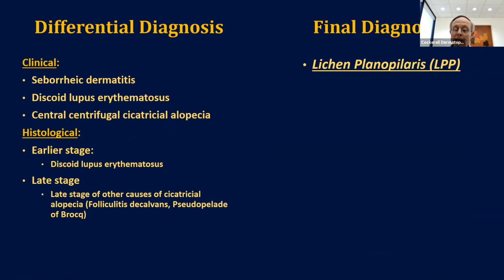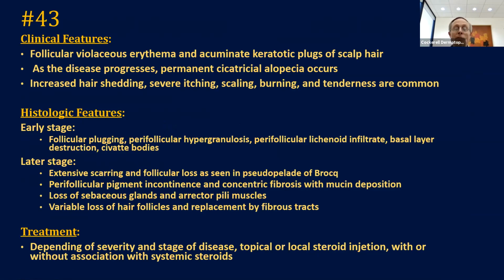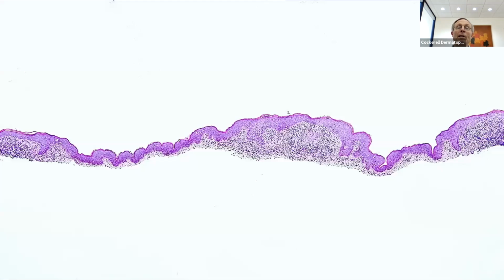Okay, so again, that was LPP, late stage burned out scarring alopecia. And the best time to get that is not when it's late. You can still diagnose it, but it's better to get it when there's some inflammation. Okay, so I hope everybody got that right.